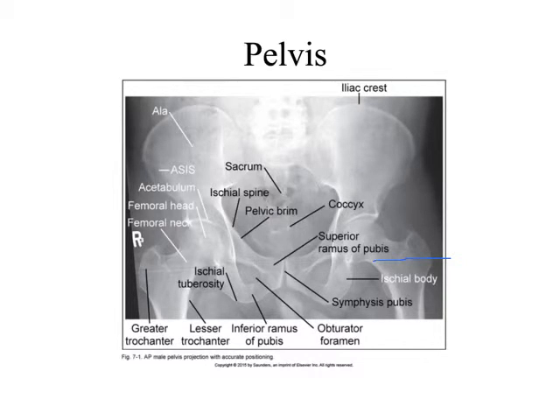So now our centering has changed. How would we describe this image? Centered on what now? It's hard to say really how this image is centered because we're basically centered on this giant hole right here, right?